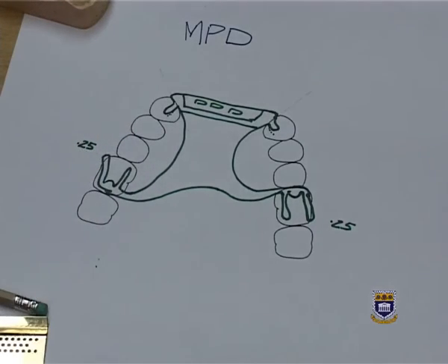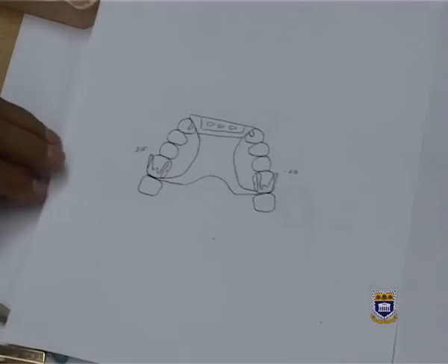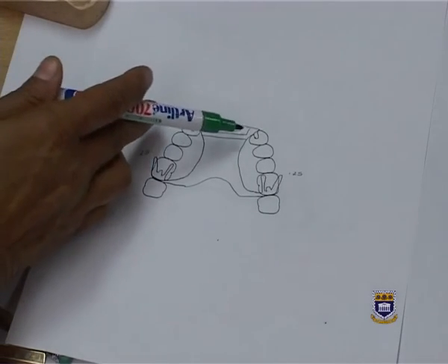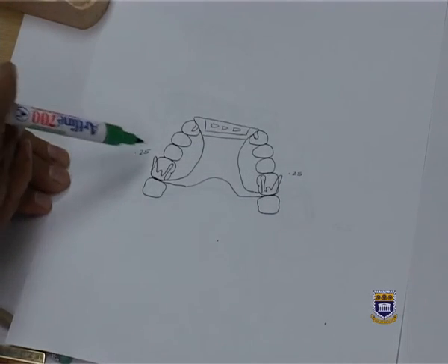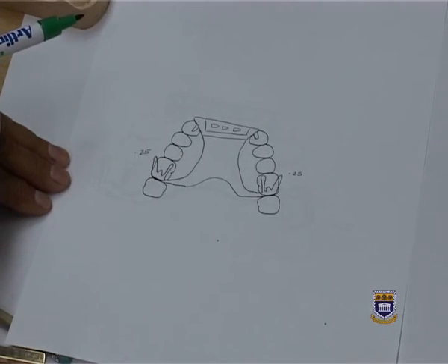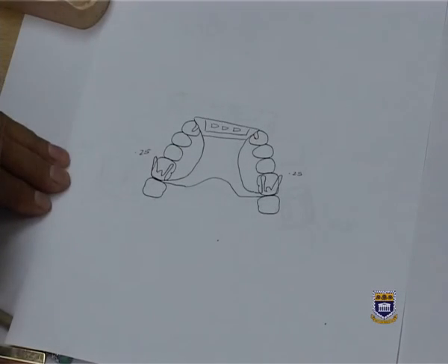So if we look at another design, where I've used 2 mesially engaging clasps, I've used the same mesial cingulum rest on the 1-3 and the 2-3, and I've used 2 mesially engaging clasps. Look at the difference. We have open components compared to when we did an acrylic design where all the components were solid lines. So this will complete our class 4 metal partial denture.